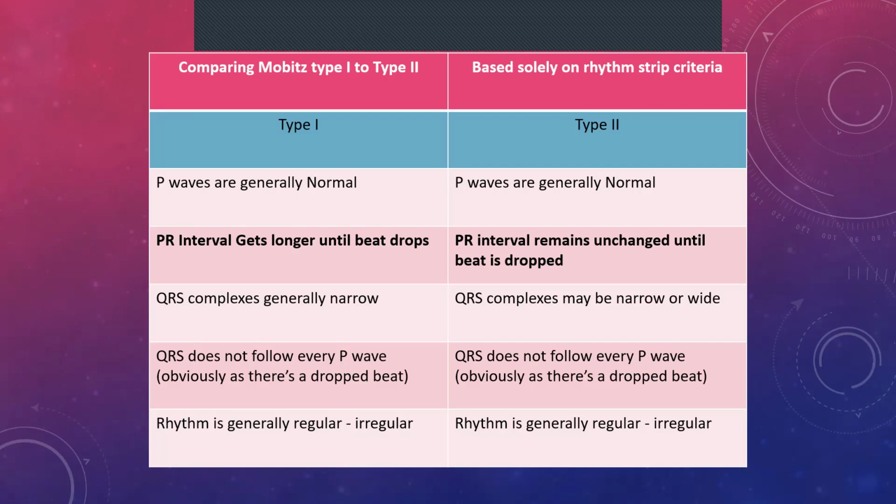It's an interesting ECG. Rhythm disturbances and rate disturbances actually account for, I would say, the majority of the problems that we see when patients are having cardiac issues, but they're also some of the most commonly missed, and they're also some that are the most commonly misdiagnosed. And the good part is that if you are analyzing the rhythm according to these 5 criteria, you find that you pick up most of the diseases, because most of the diseases related to rhythm actually just have a combination of 1 or 2 or 3 of these, with one that's unchanged or one that isn't unchanged, things like that. So it's a good practice to always make sure that you read your rhythm strip.